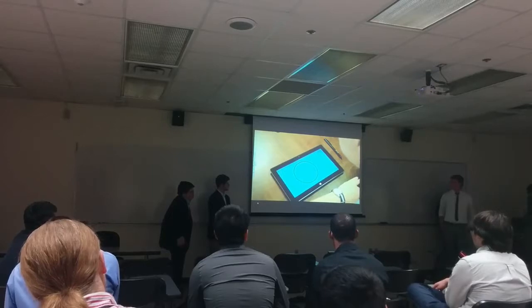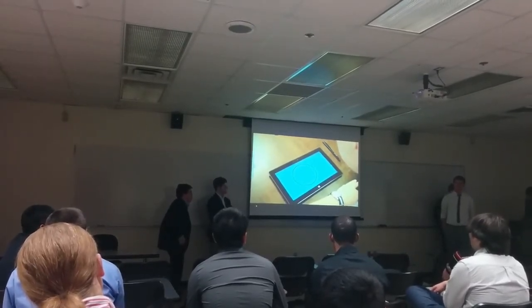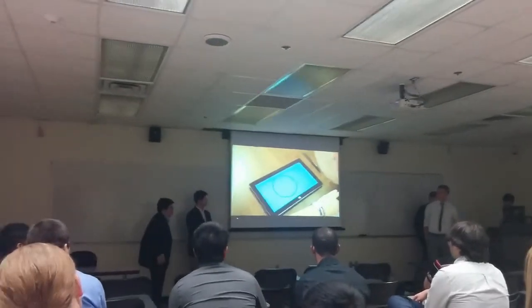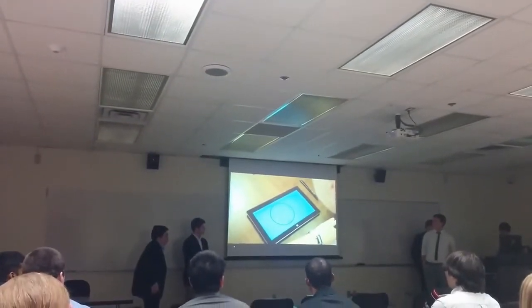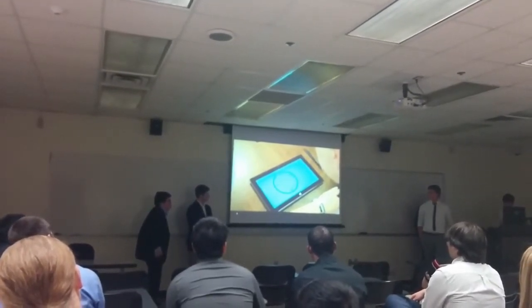SmartStrokes also allows patients to take a clock drawing test and the Rey-Osterrieth test. Both of these involve recreating a certain image. Our application allows doctors to share the test with other doctors or replay it at a later time. Here is an example replay of a clock drawing test which was taken earlier.